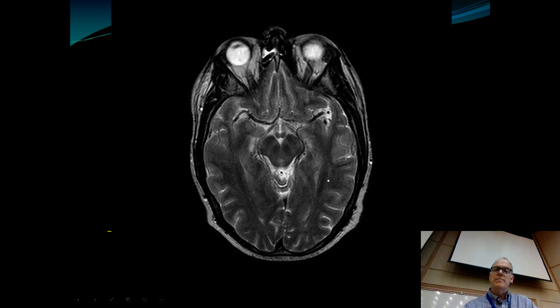Okay, this is the first time we've seen the frontal lobe. This is the straight gyrus, or the gyrus rectus, which is kind of the lowest portion here of the frontal lobe. Okay, and notice what is sitting right next to the cerebral peduncle here. It's this part of the temporal lobe, so this is the uncus. Okay, so remember the third nerve is exiting right here. So we've talked about uncal herniation and how that can compress the third nerve. And next year we'll talk about how that can also compress the cerebral peduncle.